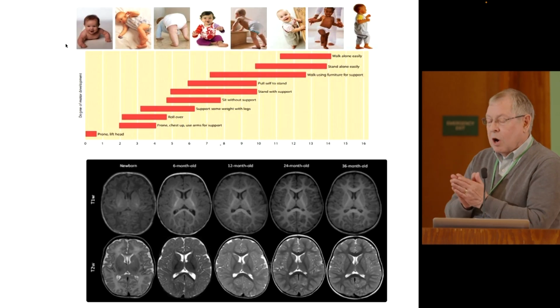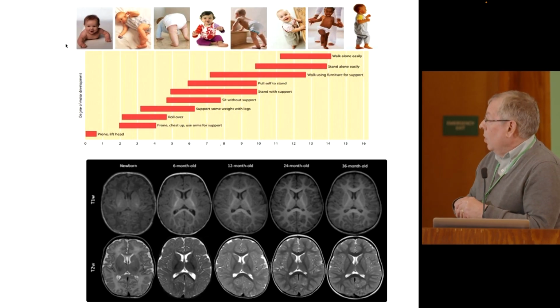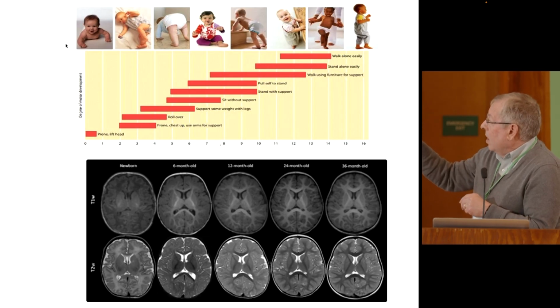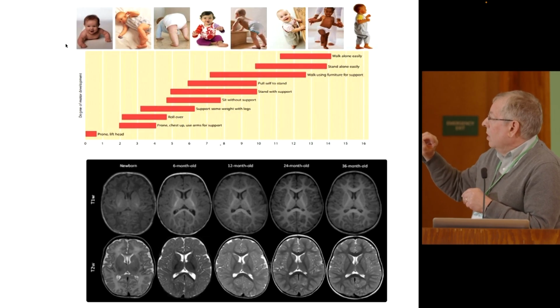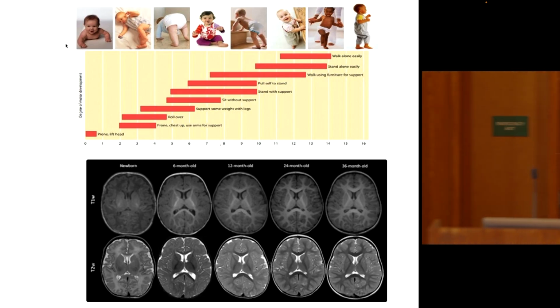These kinds of things are occurring on a natural time scale. And so we can look at MRIs from very early on, and that myelin is underdeveloped. And it develops over the course of months to where in a 12-month-old, I can see this myelin, and I'm sorry for the people on the line, but this myelin is now getting dark.